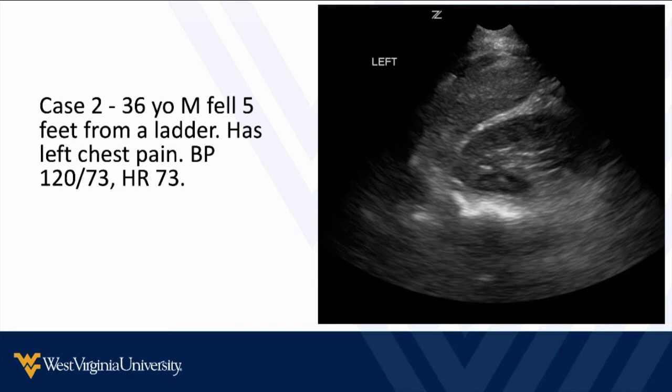I hope some of those cases help demonstrate some of the subtle and not so subtle findings that you may see in trauma, and then a little bit about how they can influence your decision making, even when you can get a CAT scan in 15 minutes, even when you don't have surgery immediately available. No matter what your resource setting, having this information within 2 or 3 minutes at the bedside adds value to your patient's care.